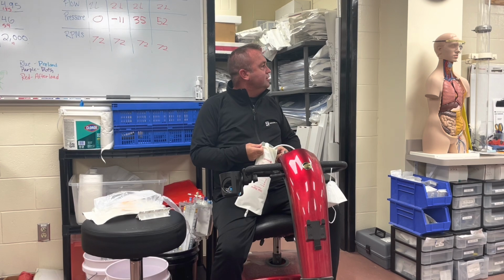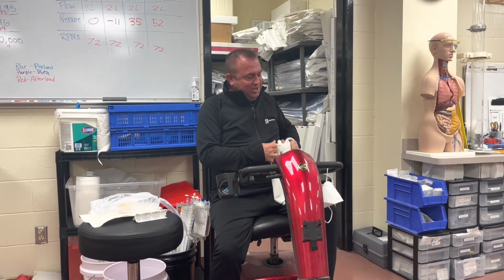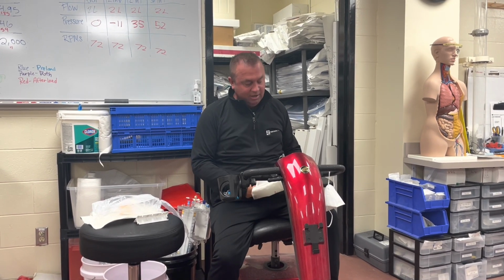Let's look at him, tight one. It's great for the video. Look at him struggle. Look at how much he's struggling to put that bag in.